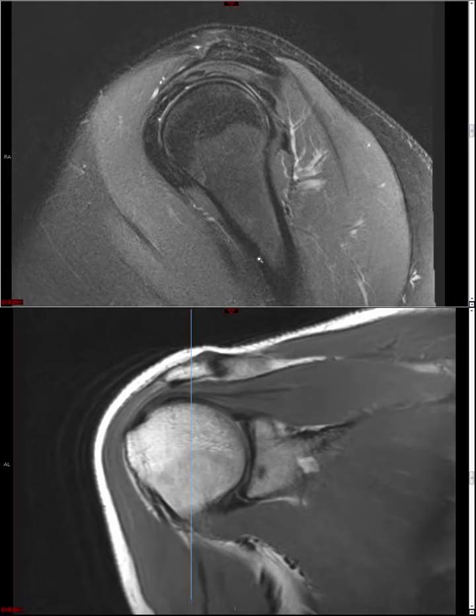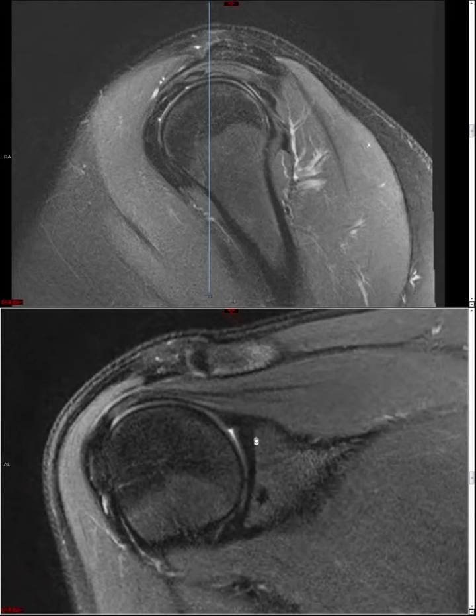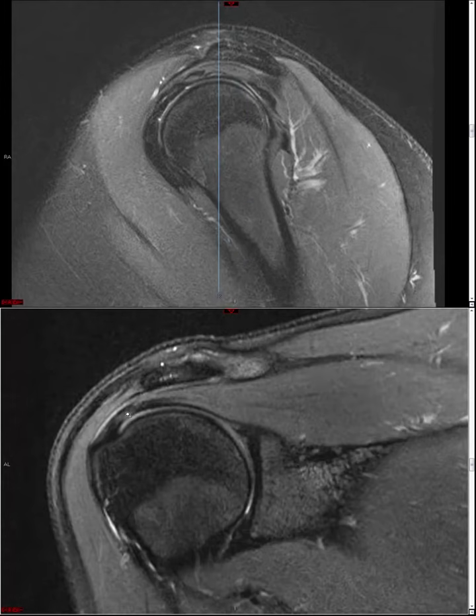Now let's spend a minute or two talking about bursae, and I think the most important one is obviously the subacromial subdeltoid bursa, and as the name would imply, this is a potential space that we see deep to the deltoid muscle. So you see this thin high signal band, that's the bursa itself, and of course it's subacromial in location as well. As in the normal situation, it's a potential space, so it's actually collapsed and devoid of fluid for the most part.